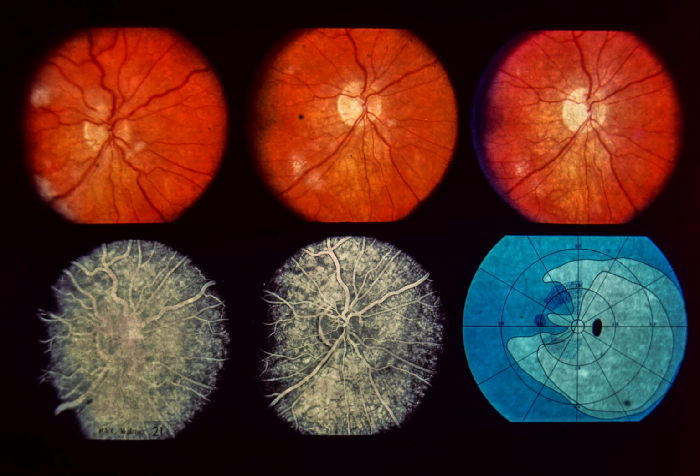Upper left. The superior and nasal portions of the right optic disc are edematous and hyperemic. The retinal veins are dilated, and 3 large cotton wool spots are present. Lower left. A fluorescein angiogram shows leakage from dilated optic disc capillaries. Medical evaluation included 3 positive LE preps, a normal sedimentation rate, a negative screen for antinuclear antibodies, and normal serum complement levels. The patient was started on prednisone.